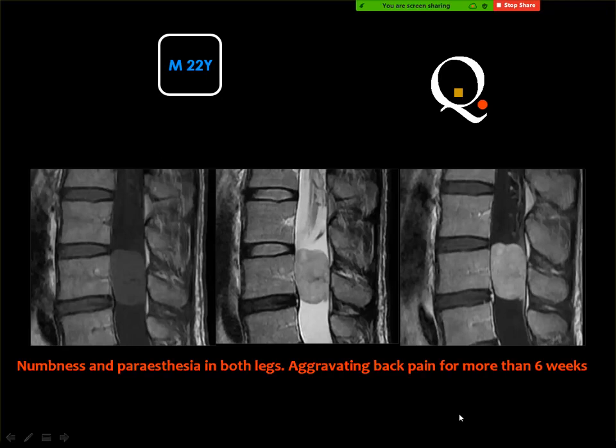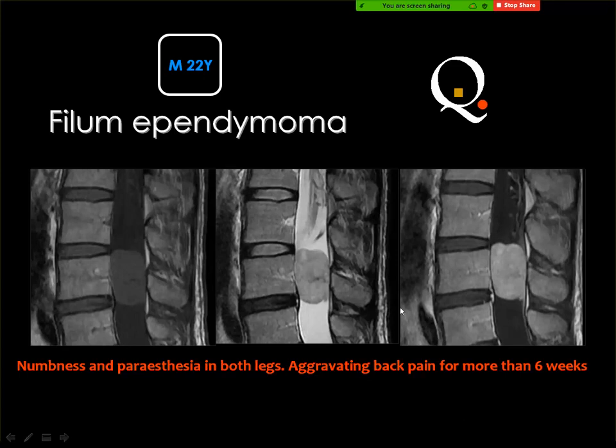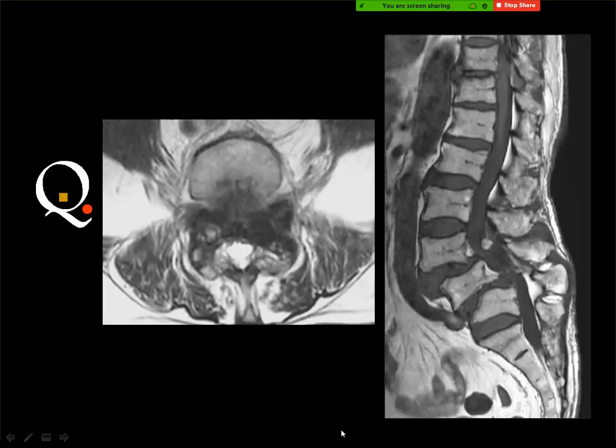Neurofibroma. Okay. Meningioma. Yes, as in the differential diagnosis we have mentioned before. Because this lesion is not heterogeneously enhancing, you can exclude the possibility of neurofibroma somewhat, but because of its intimate relation to the filum terminale and the conus, you may think of filum ependymoma. But many times you provide only the differential diagnosis of a meningioma, neurofibroma, schwannoma, and myxopapillary ependymoma. Next case.